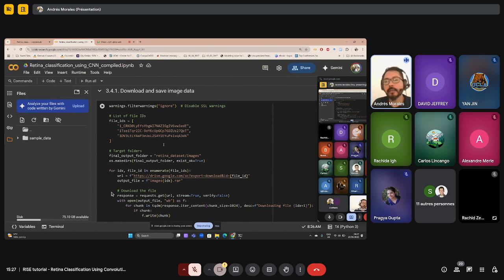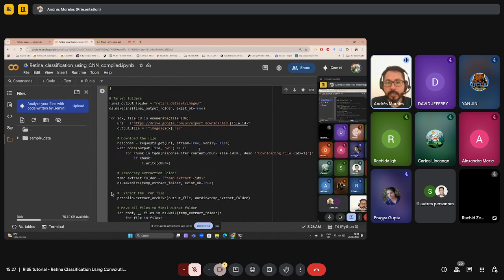This is just so it can be imported automatically from the notebook, and to avoid any request to run the antivirus, because with Google Drive, if the file is too big, you get a request for an antivirus check and it becomes problematic. So the dataset was split in 3 parts, and the function here will do the following: we take any of these files and put them in the right format.